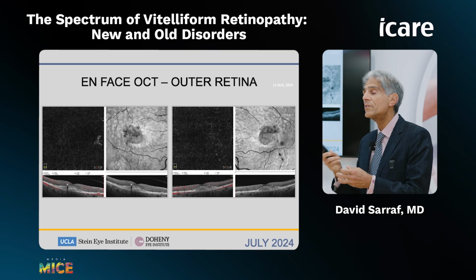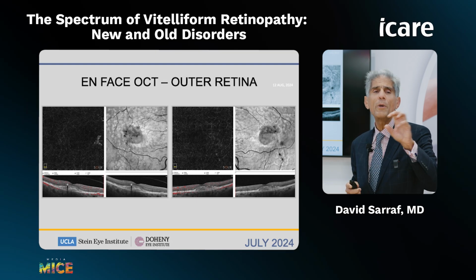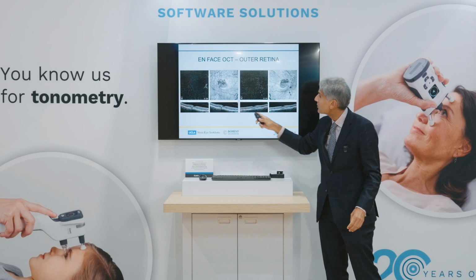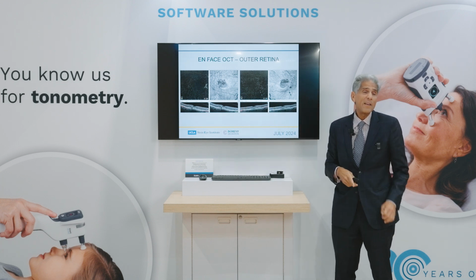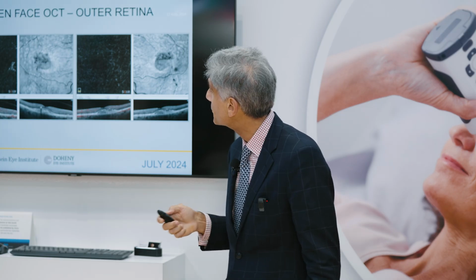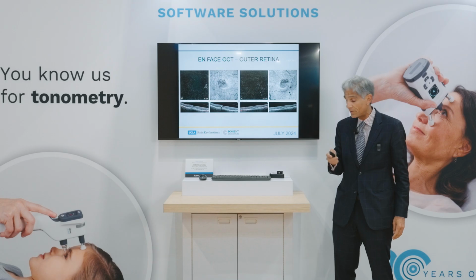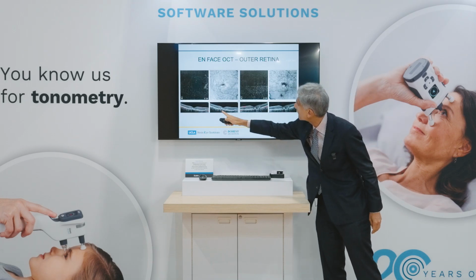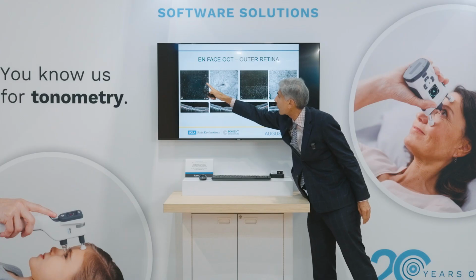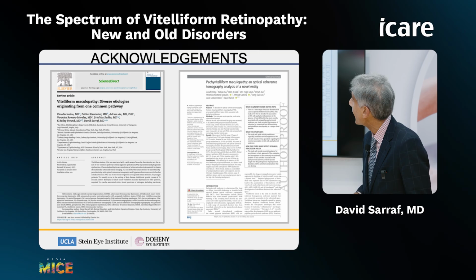And the question was, is that neovascularization driving the fluid? We didn't think so. We thought the fluid was a consequence of the vitelliform lesion, but we had injected anti-VEGF. There was no change as we suspected, and now we've decided to stop the anti-VEGF injections, even though he does have peripapillary neovascularization. And then again, you can see the lesion, that kind of RPE scarring that developed, and then a more prominent neovascularization there that you can see with that OCTA.